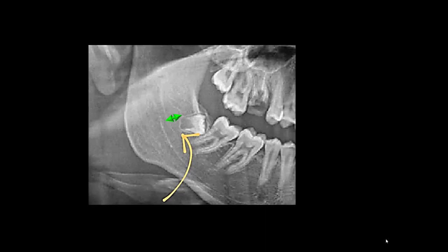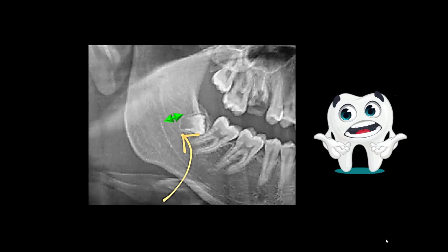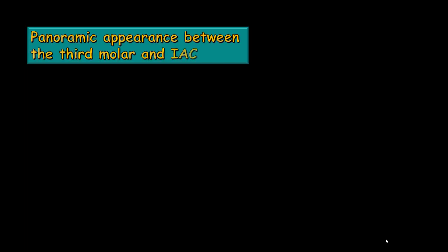If you didn't get this, it's okay. Just go over this part of the video and listen to it again. In the panoramic radiography, these can be really important tips before planning the treatment and going through a surgery.